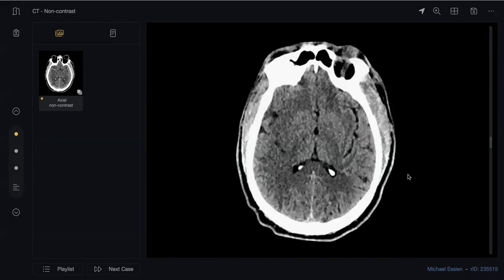In case of hyperacute stroke, you're scanning the CT scan of the patient, browsing through it on your desktop, and you're not able to appreciate the hypodensity. What will you do then? I would look for the stroke window. Yes. What is the stroke window?